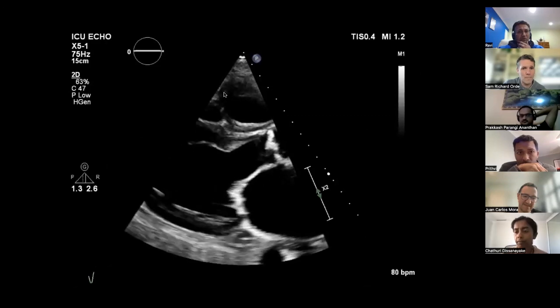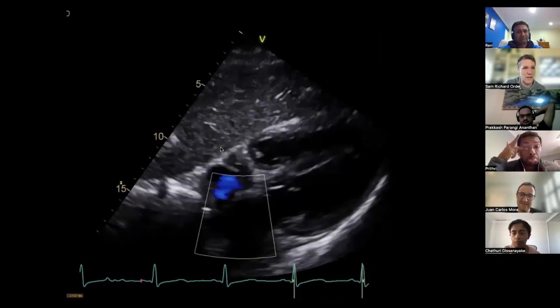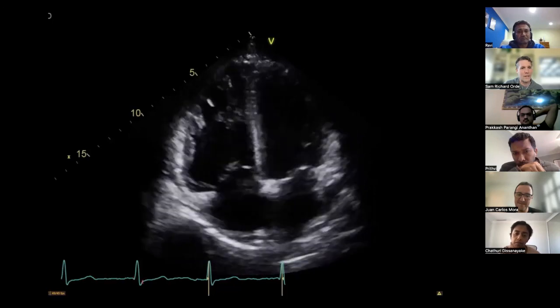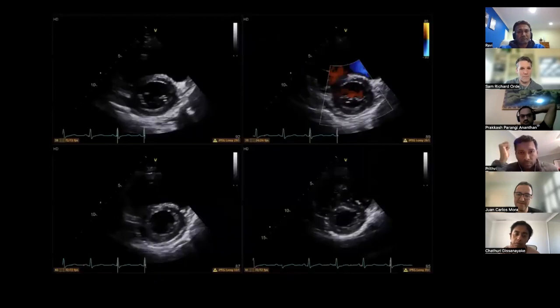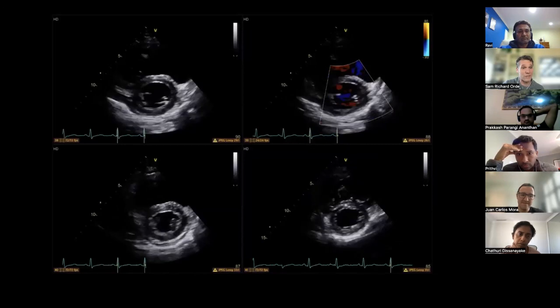Sorry, Sam, did you do a bubble study for that? Great call. Absolutely. Sorry, we should have said we needed a bubble study. We did not have one routinely done. This was not something that was reported by the sonographer, unfortunately, which I was a bit surprised about. I'm totally with Juan on this one. This was markedly abnormal for me, and the thing that made it markedly abnormal was the short axis views.